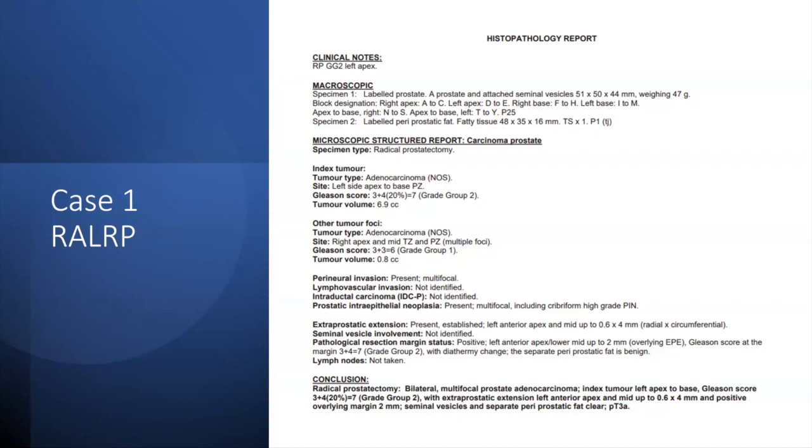But look, just thinking on my feet here, if you had a lesion this large and only really reported on the pattern 4, then you are underreporting another significant component of what this tumor is, and that's volume.